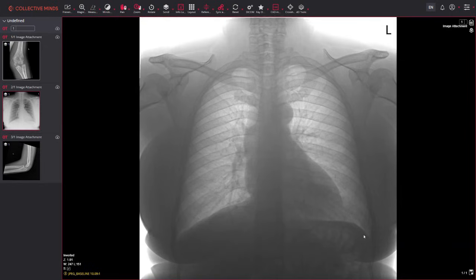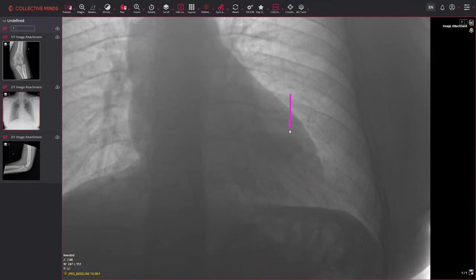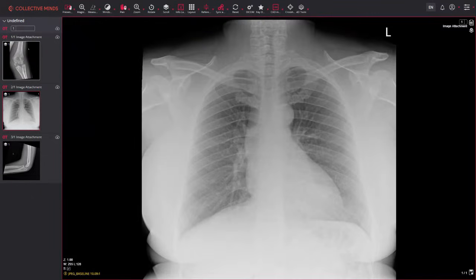And the eagle-eyed amongst you will have been able to see, it wasn't obvious on initial viewing, but actually now we've inverted it and windowed it, we have this lobulated soft tissue mass area here behind the heart. So this turned out to be a left lower lobe cyst, but could easily be a cancer. And unfortunately, cancers have this nasty habit of hiding. Typically behind the first ribs, but sometimes at these extreme lung bases or behind the heart. So if you take anything away from this, when you're looking at chests, just remember to invert the image and check at the apices, behind the heart, under the hemidiaphragms as a second check.